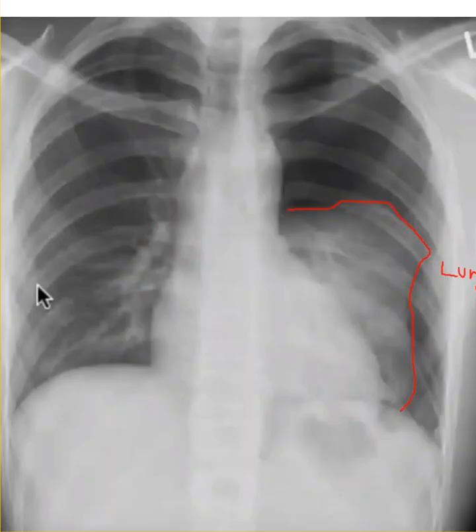Okay, so here's the expiratory film on the same patient. And you see a huge difference. You can see I've already marked the lung. This is the pleural line that I have marked. And you can see it on the film that I've posted already, without any markings. It's really obvious. So that's a hell of a pneumothorax right there. And this particular case is obviously more than 20%, so I'd put a chest tube in him and admit him.